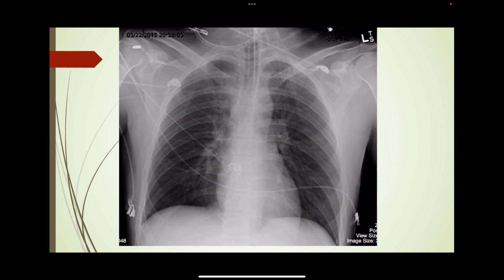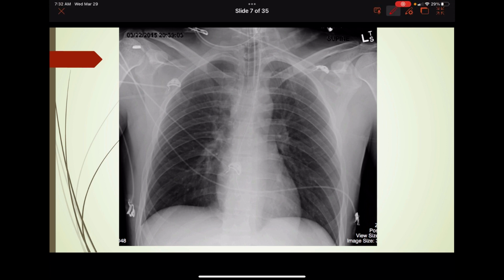So here is a chest x-ray with some various things going on. Start with A, come to the airway. Here's the trachea. See, it comes down here. Here's the carina. And you can see there's something in this airway coming down here. There's an endotracheal tube stopping right there. It's right about the clavicle, so it looks like this is about 5 centimeters. So that's good placement of the endotracheal tube.